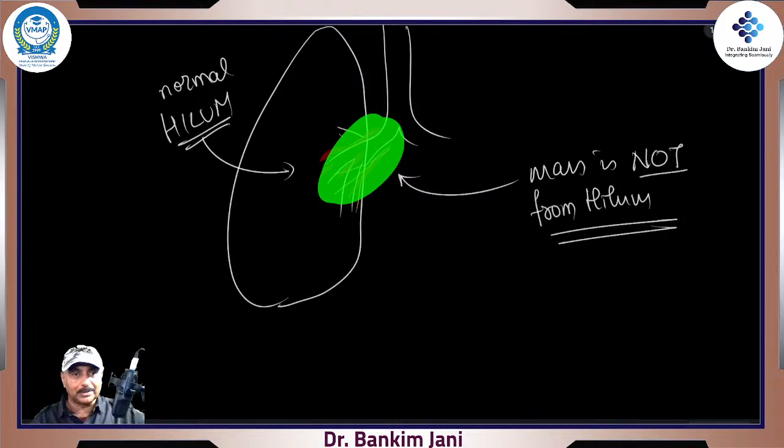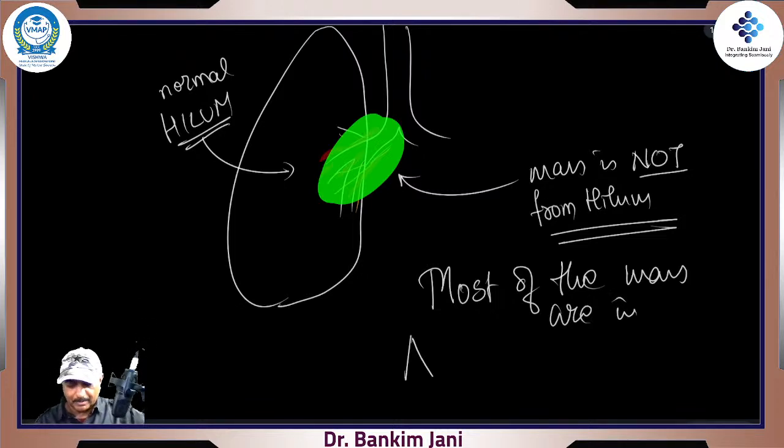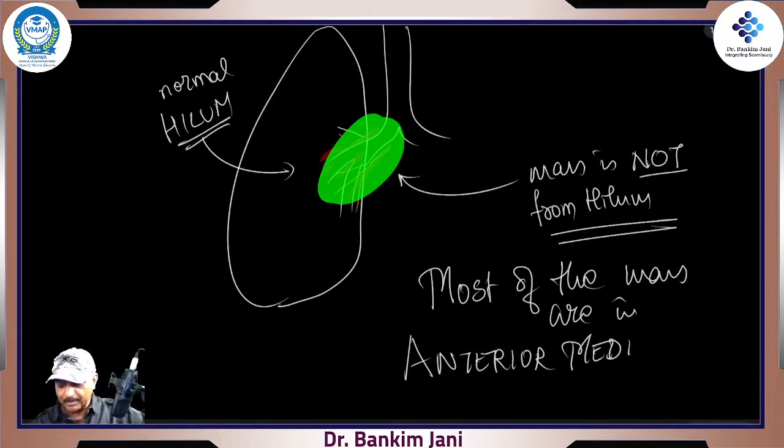So most of the masses, if this is the situation, are in the anterior mediastinum. Remember this.